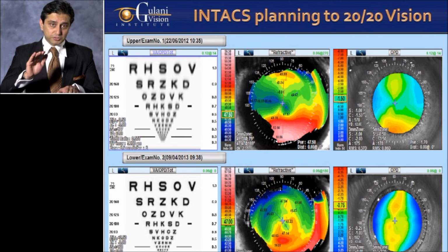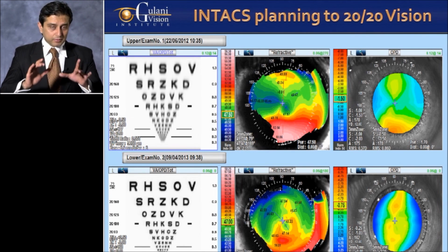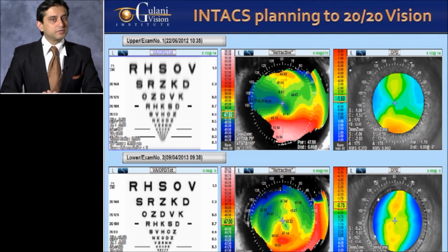You can make a superficial and a deeper channel, manipulate the whole cornea with that one opportunity you have, and shape it up. And patients do achieve vision of 20/20s. It is possible. So the planning is very important. If you look at this OPD of the patient pre-op and post-op, you can see pre-op this patient with an RGP contact was 20/25. But with just intacts, without contacts, you can see the severe improvement in quality and why this patient is very happy.